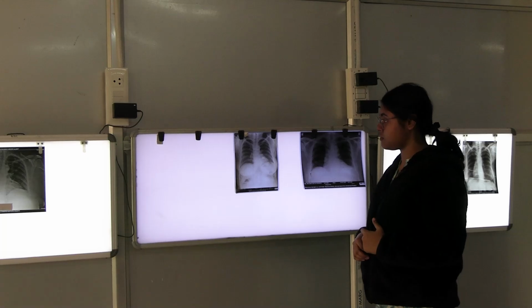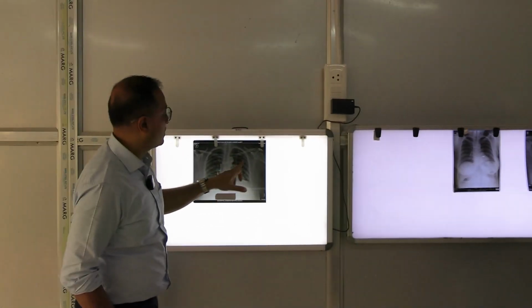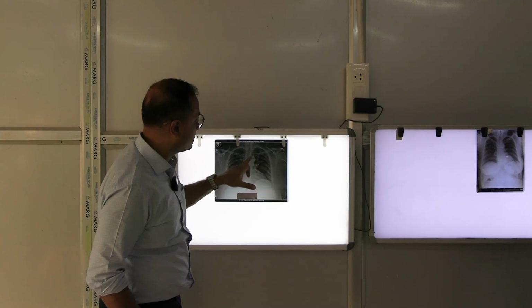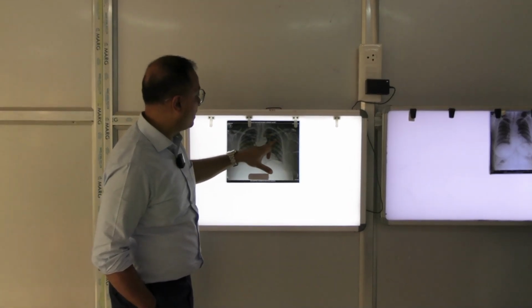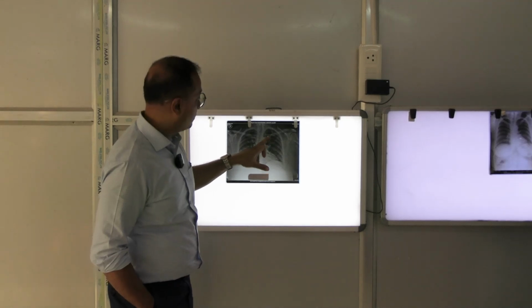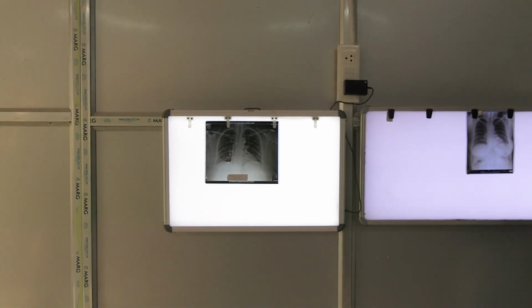That means counting will be from back to front, okay? This is how we count ribs. So you count the ribs like this, not like this, the impression which you are seeing here. This margin, whatever you are seeing here, is the posterior end which is ending on the vertebra. Okay? What other bones are you seeing? What are other bones you are seeing?